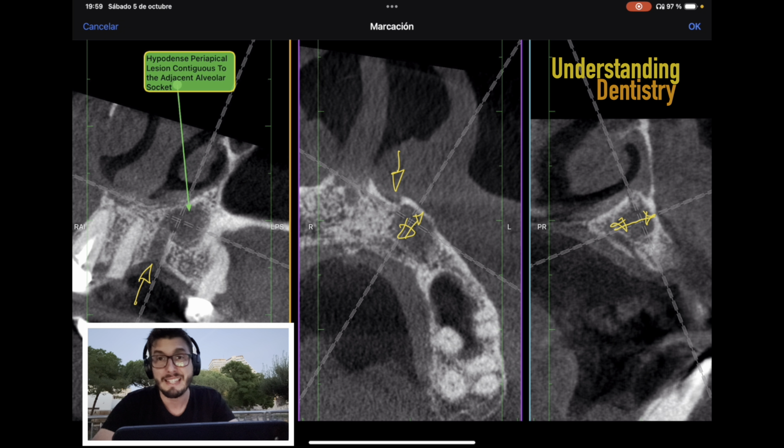That's the thing. So take a look at this. In this case, we have a radicular cyst associated to an endoperiodontal lesion. We have a sinus polyp, and then we have a residual cyst. So four very common lesions that you might find in your careers. That's why I decided to bring this to you.